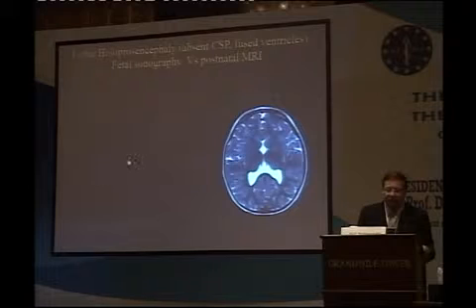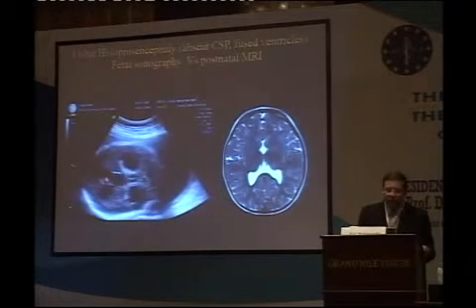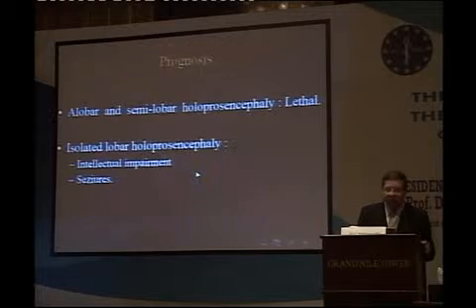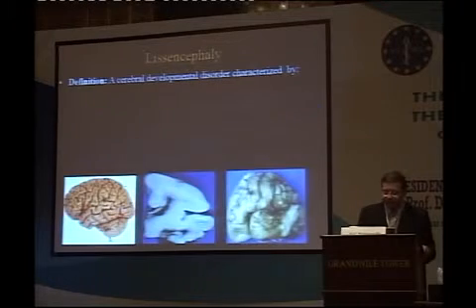You can see here in that film, look here, there is fusion of the ventricle anteriorly and absence of the cavum septum pellucidum, and again compare it with the postnatal MRI. Now the prognosis: alobar and semilobar holoprosencephaly are lethal. Lobar holoprosencephaly is associated with intellectual impairment and seizures.